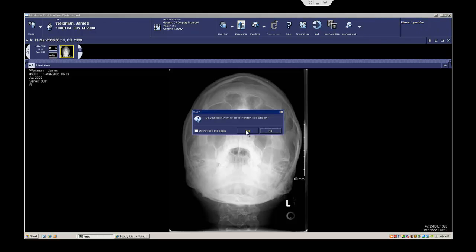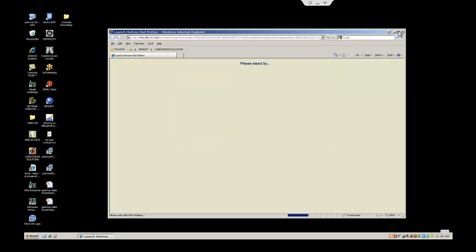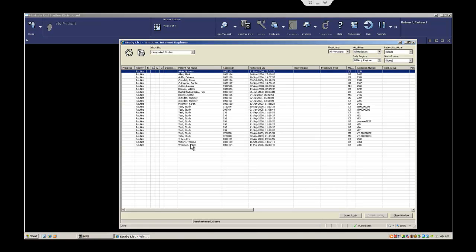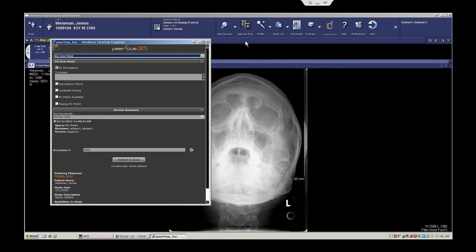Now, switching over to the radiologist workflow, typically the next morning, where we're logging into PACS and addressing the evening or the weekend's emergency department preliminary reads so that final formal reports can be created. Once we're logged into PACS, the radiologist would navigate to their appropriate study work list. They would have the capability to launch to the exam in PACS, and peerVue would then have the capability to launch the appropriate ED overread panel.